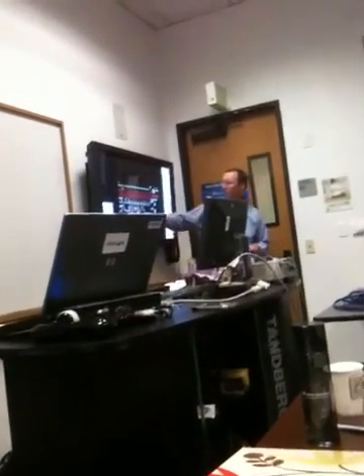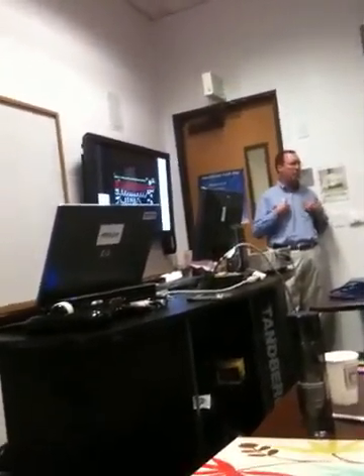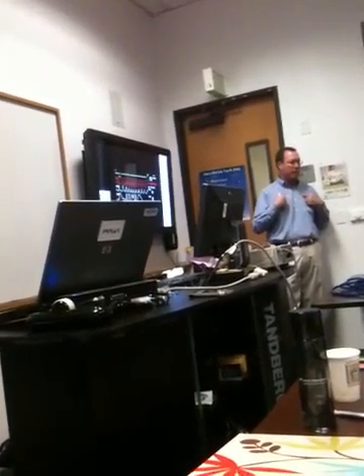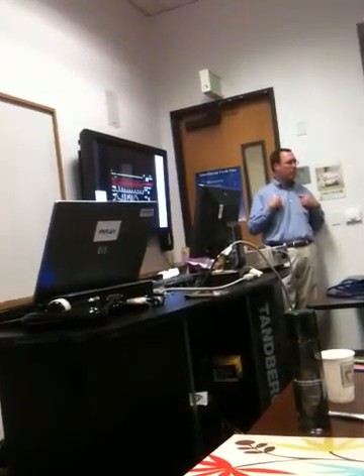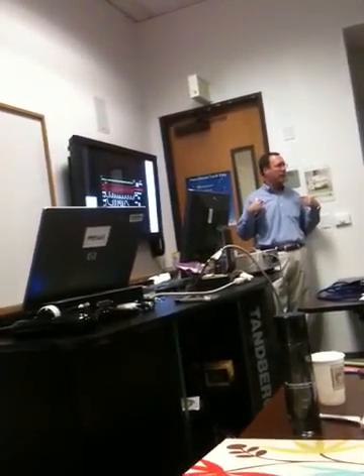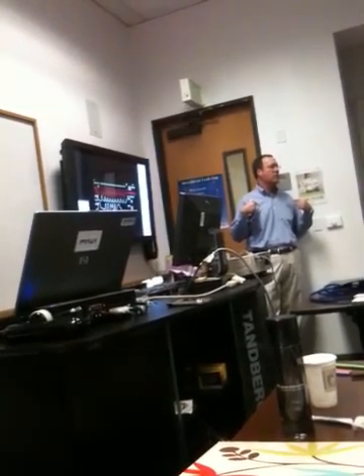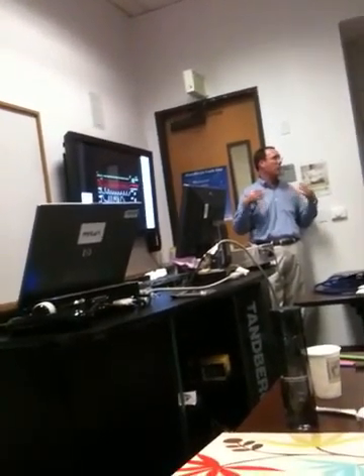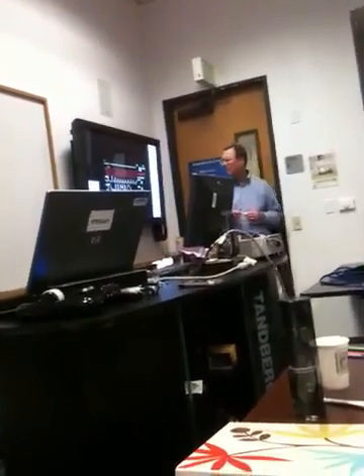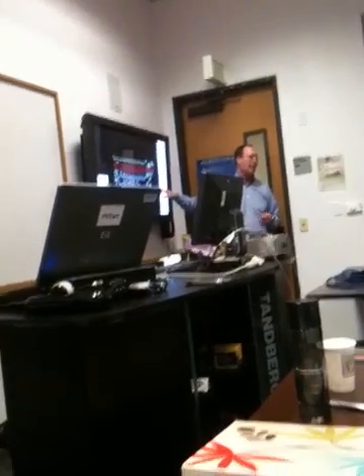Down on the bottom here, this shows you respiration, and what they'll do is the machines are usually built so that the EKG leads, as the electrodes move a little bit while people breathe, change the resistance between 2 electrodes, and the machine will interpret that as the chest moving for respiration. So sometimes that's accurate, sometimes it's not.